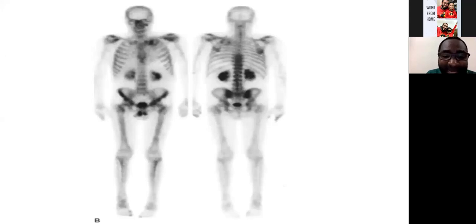The additional advantage that you will get with a bone scan is that you will be able to see the viability of the bone, whether the scaphoid bone is completely necrosed or not. So that is the additional information that you will get. But these days, we hardly get indication for a scaphoid fracture. MRI usually is a better imaging modality.